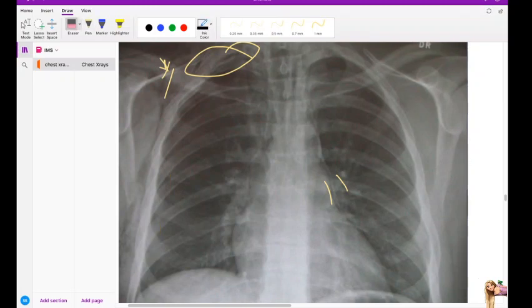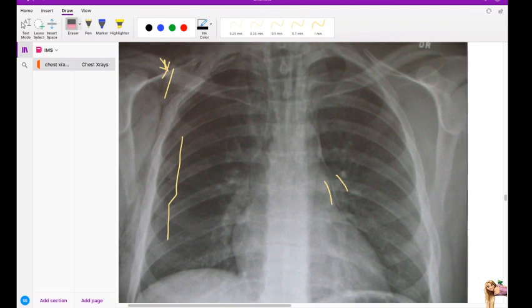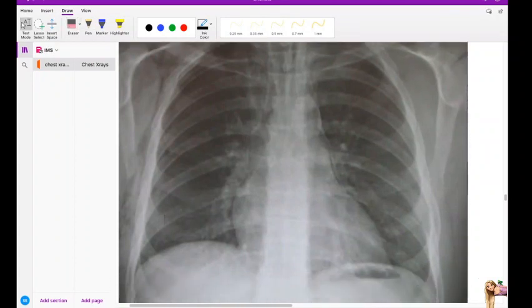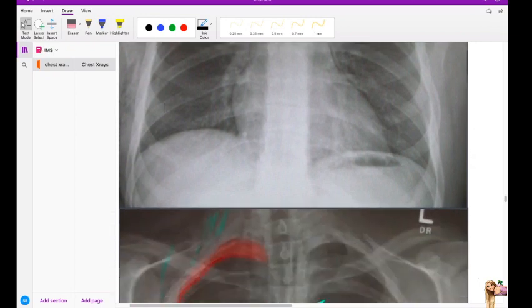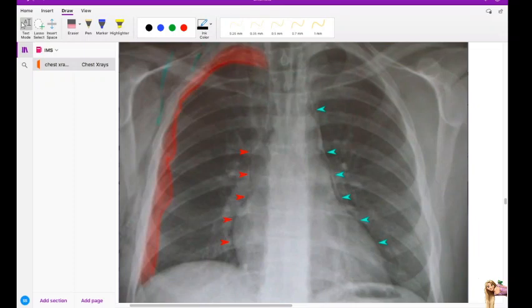There is some line on the side. Feel like there's a line on the side. Okay, so I think they've marked it over here. Oh, there is. It's here. Forgot that there was answers here.